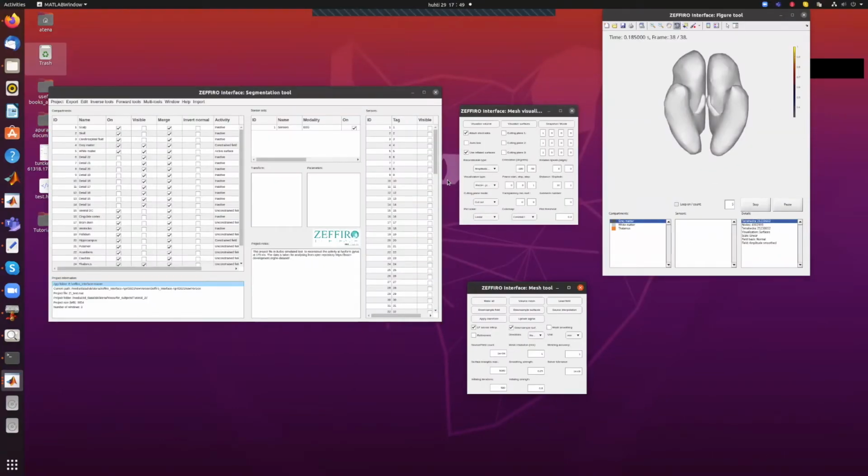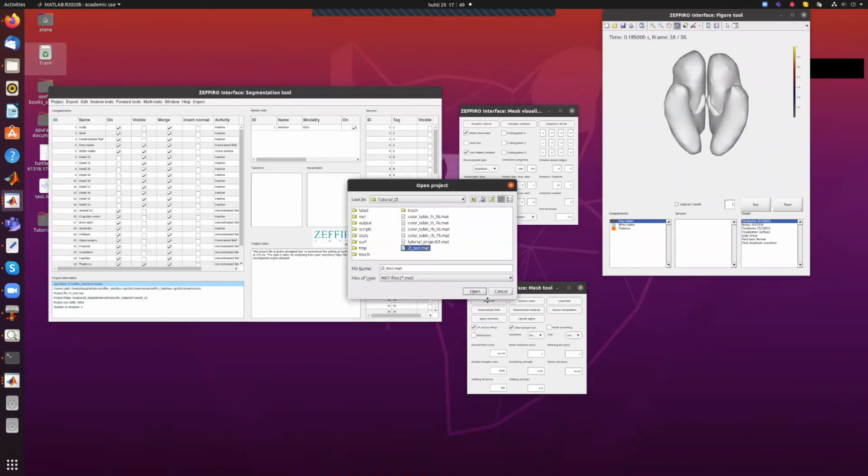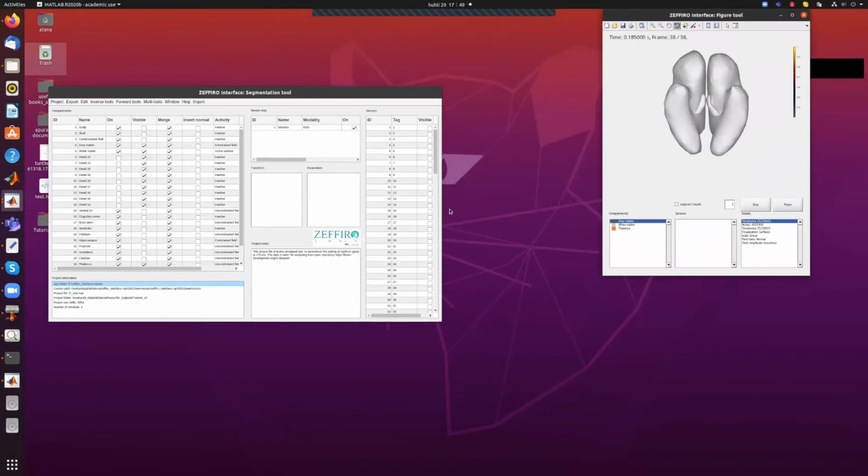In this video, we are going to find out how to open the project file and localize a synthetic source, and then visualize the time lapse of the created synthetic source. So for this, I will open the project file that I created in the previous session. From Project, then Open, then project file.